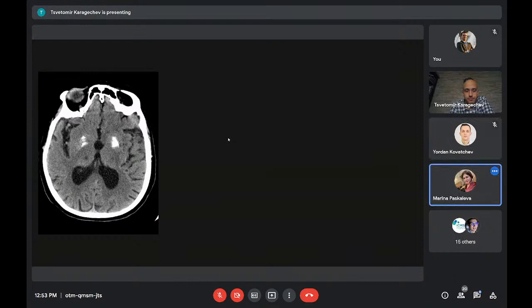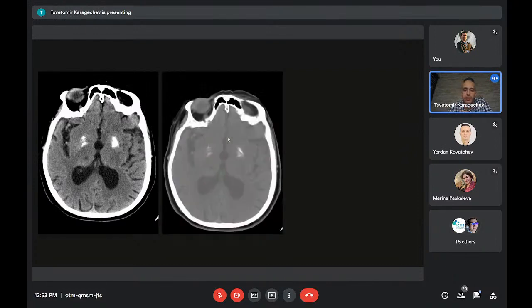Calcification, maybe? Yeah, actually, you're right. And just so you can take something as a home message, I'll show you a couple of ways that you can be sure. What you see here is the very same image, but this is a bone window. We talked about windowing in the beginning. This is a very wide window. You see the gray-white matter difference cannot be appreciated on this image, but we see that these structures, or actually the biggest part of them, are really dense. They are as dense as the cortical bone.